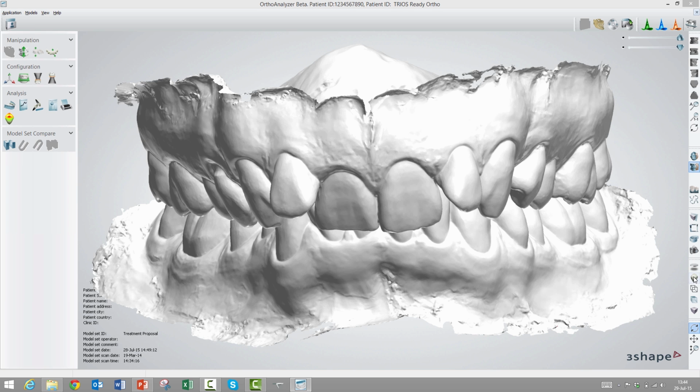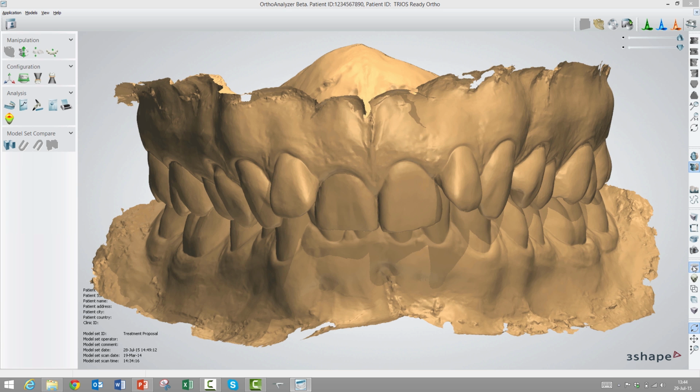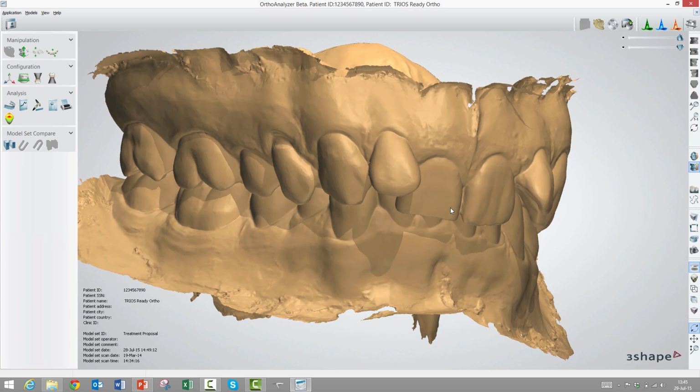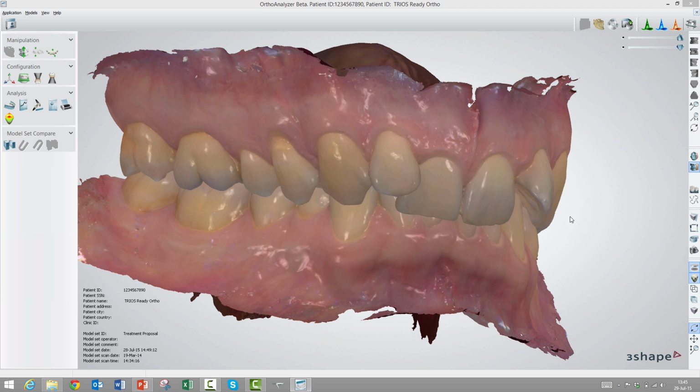When I'm in this mode, the first icon that I skipped actually becomes useful, because this is a very, very flat, almost black and white picture. When I click the first one, you can sort of mimic some shadows and make it look a little nicer. I recommend that you use this tool primarily when you are working in a texture mode, like I have down here, because this gives you very nice shadow and lighting features. So it's a little bit easier to look at. That's basically what these two icons do. But for now, I'll just go back to the nice Trias colors.